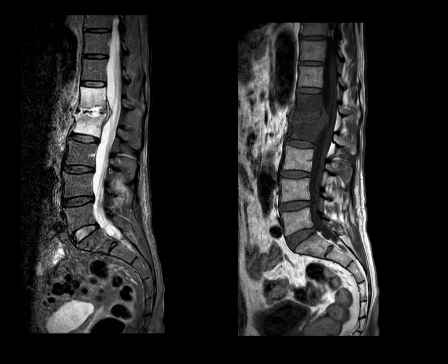Here's our MRI scan on the same patient. Of course, this is a more sensitive examination, giving us more information. There's some fluid here, probably in the disc space. This would probably be pus, extensive edema in the bone marrow on this fat-suppressed T2 weighted image, and bulging of the posterior longitudinal ligament here into the spinal canal. T1 weighted image here demonstrating signal loss.